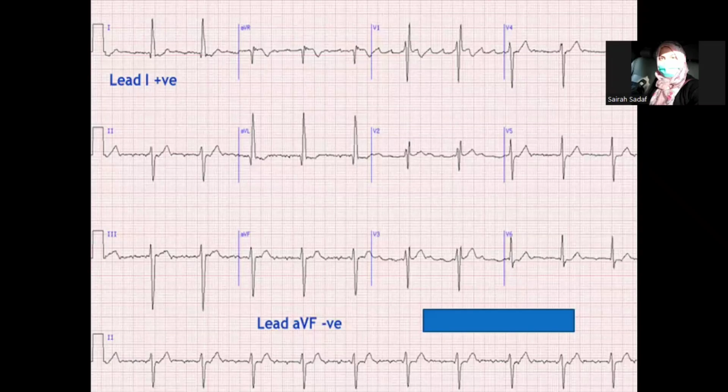The AVF is negative and lead 1 is positive. Now tell me which axis is this? Okay, we have a lot of lefts here. Khizar, Jennifer, Adnan, Huawei, Dr. S, Safila, Myra, Sadia, Aruj, you all are right. Ali, you're right. Alina, Adnan. Okay, Adnan is saying lead 2 is pathological.